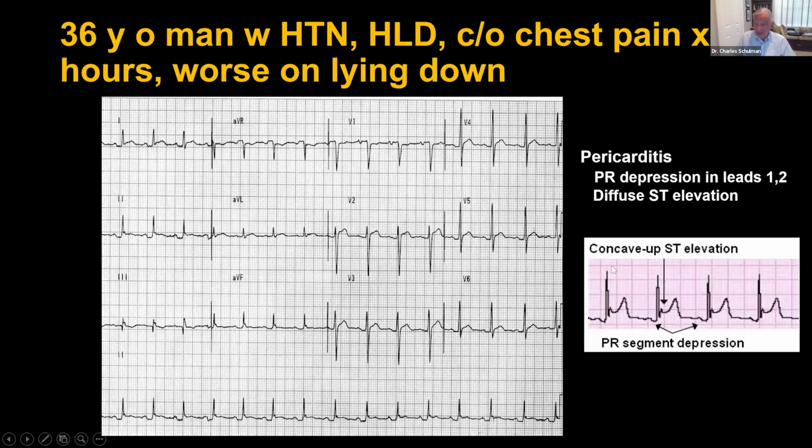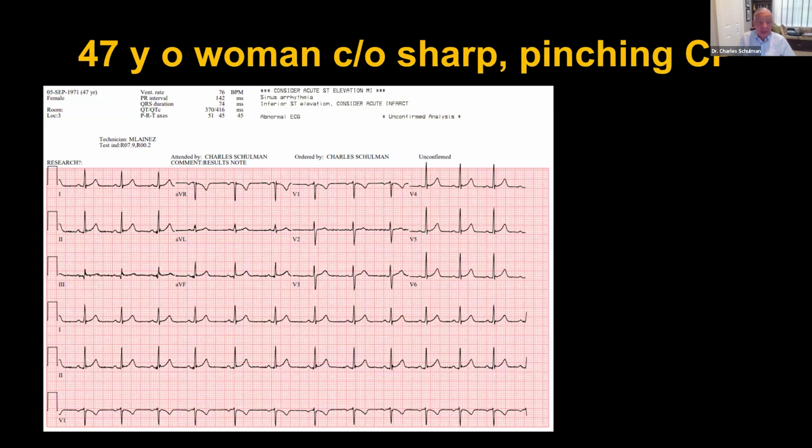Okay. The ST elevations are not so well shown here, but often concave up, along with the PR depression. Okay.